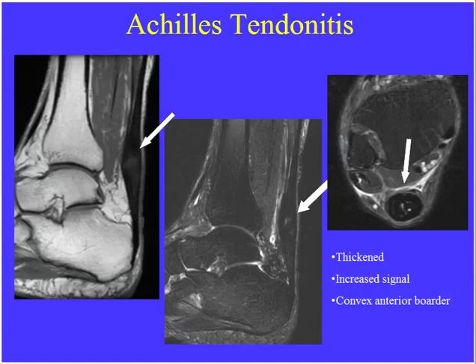If they show it on the axial plane, at the most, the anterior aspect of the Achilles tendon should be flat. It should never be convex anteriorly. So when it starts to look round or convex anteriorly, that represents Achilles tendinosis. So they may show you this and give you the differential of the torn Achilles tendon, Achilles tendonitis, and in this case, this would be Achilles tendonitis. If there's a tear, there will be a gap with retraction of the tendon. So you actually see fluid running across the tendon with retraction of the fibers.